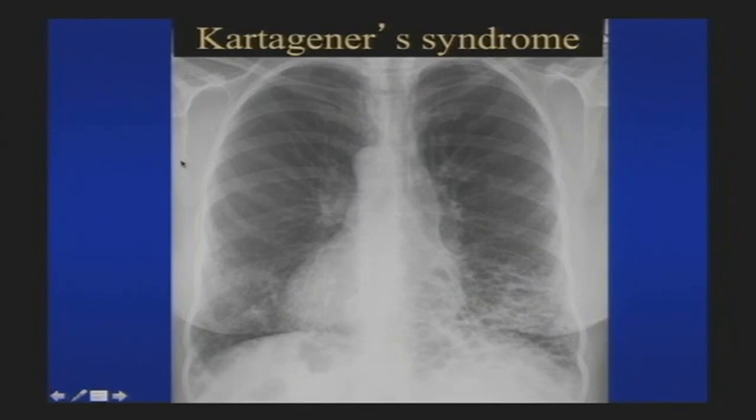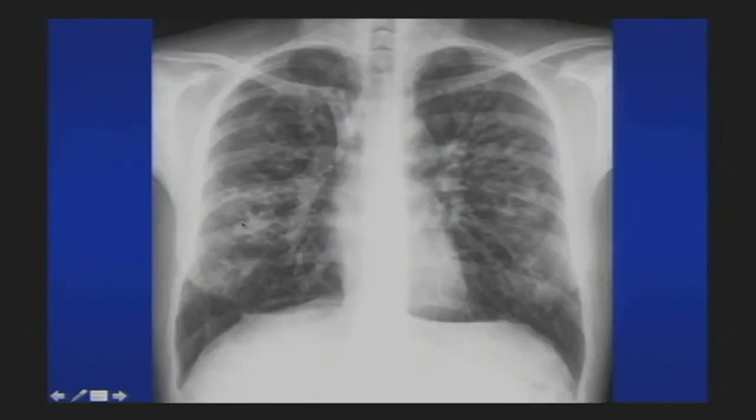Okay, here's someone with more upper lobe predominant abnormalities. Notice how some of these airways you actually can see, they look tubular. You see two parallel walls there, so this is airway dilatation and inflammation with air at the center, and some of them look more like solid cylinders because they're entirely filled with mucus. But cystic bronchiectasis, more upper lobe predominant, when you see that distribution, almost always it's going to be cystic fibrosis.